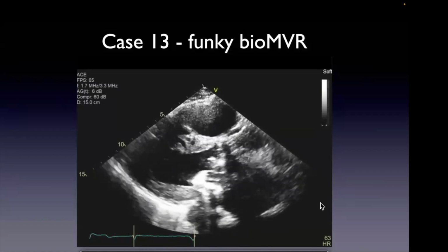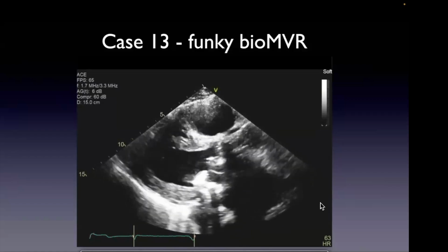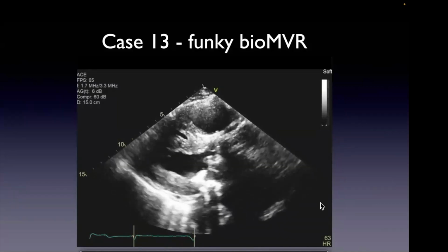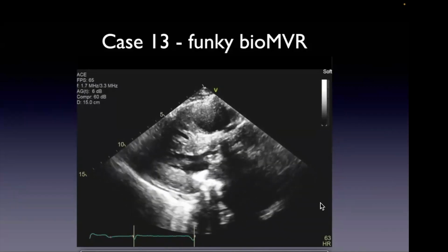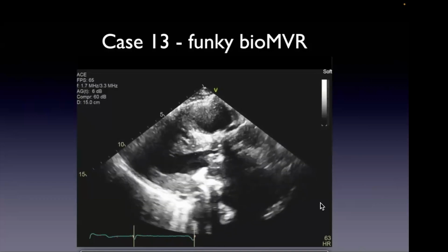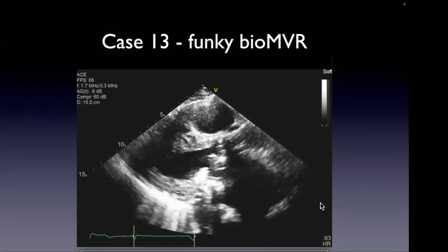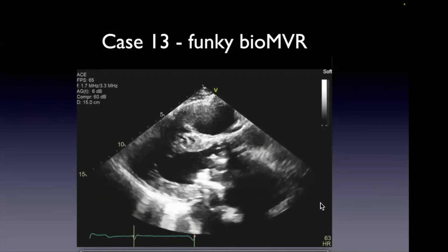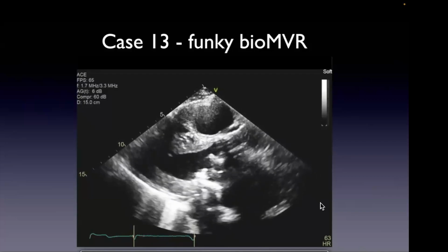Oh no, what I'm saying is that if it was inverted, then the patient wouldn't have been able to survive to this end, because the valve wouldn't be able to open. Right? Yeah, the valve is not made to. It wouldn't be possible. Yeah.